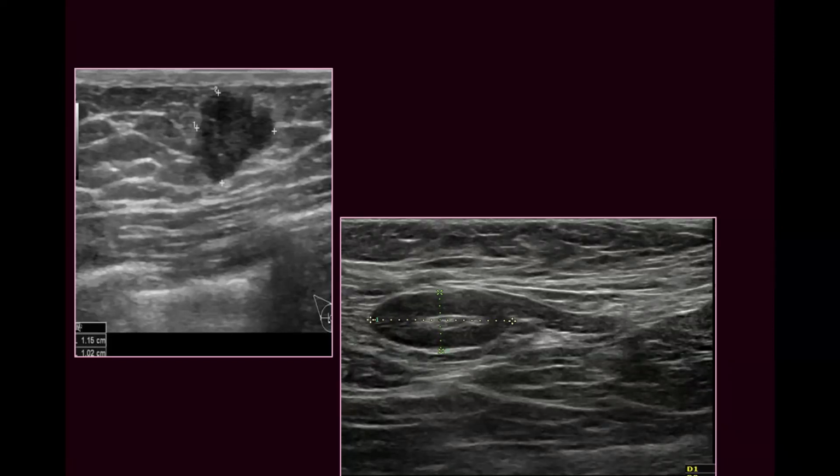Or do you recommend follow-up or something regarding the adenopathy? Do you recommend biopsy for this lymph node or not, and why? We recommend further evaluation by biopsy because the lesion is infiltrating the anterior mammary fascia.